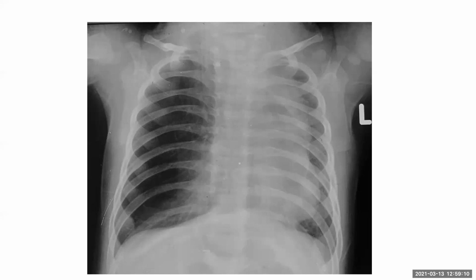I cannot appreciate any chest wall abnormality to call Poland syndrome. So I would urgently convey my findings to the referring physician, as the patient requires further evaluation with CT to confirm my findings.